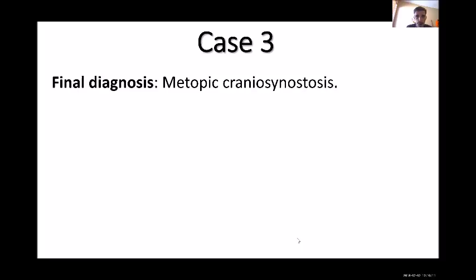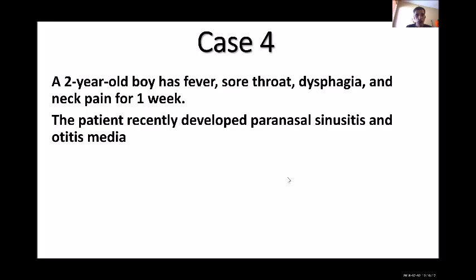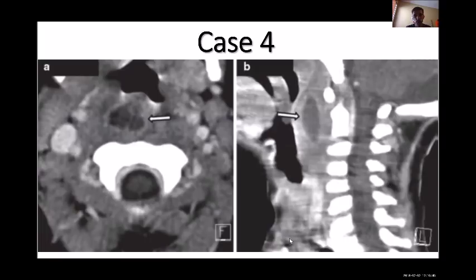Okay, we have one more person joining. That's good. Oh, another one. Oh, good. So case number 4. A 2-year-old boy has fever, sore throat, dysphagia, and neck pain for 1 week. The patient recently developed paranasal sinusitis and otitis media. And this is the CT scan.